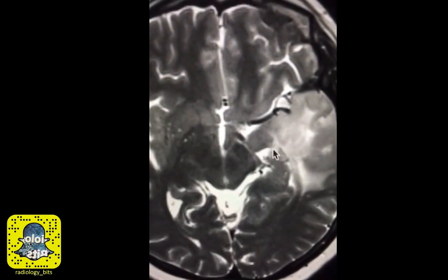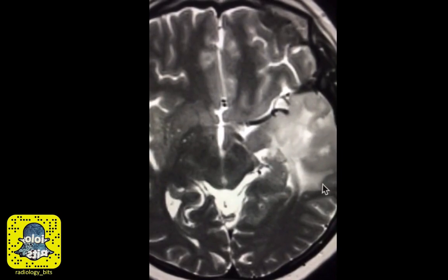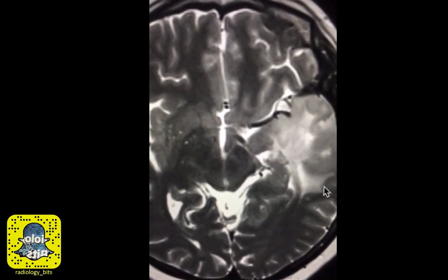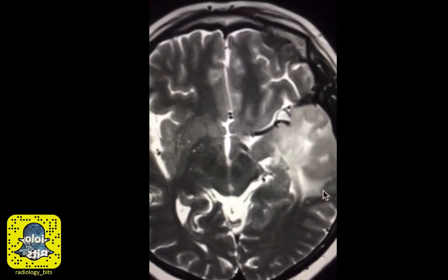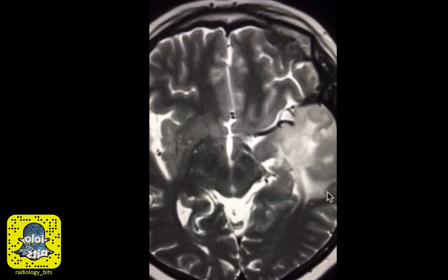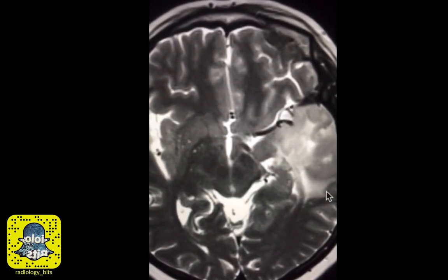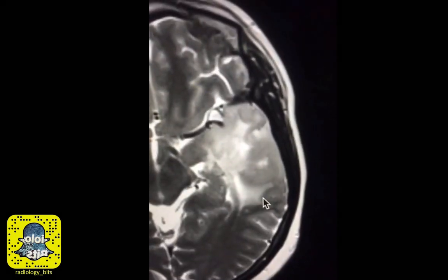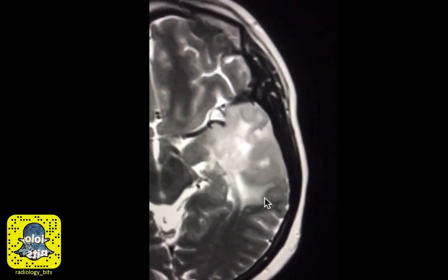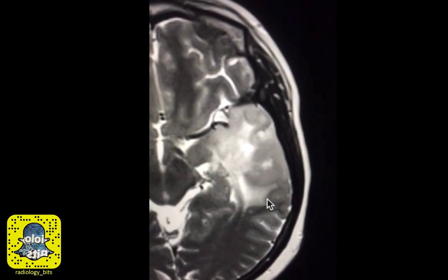Large areas of high signal intensity on T2 could represent stroke, infection, or neoplasm. The presentation with stroke and infection would be more acute, while it's very different when it comes to neoplasms. We mentioned a few imaging differentiating points between these categories, and we talked a little bit about status epilepticus.